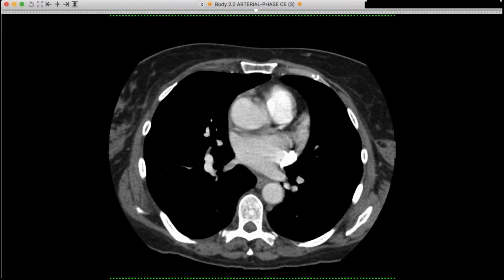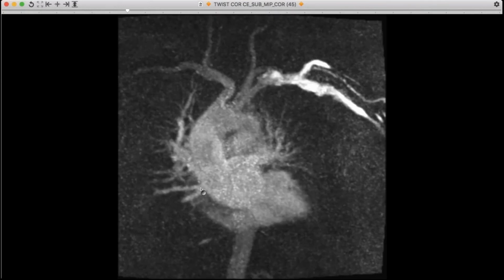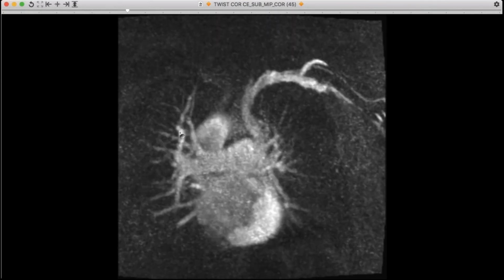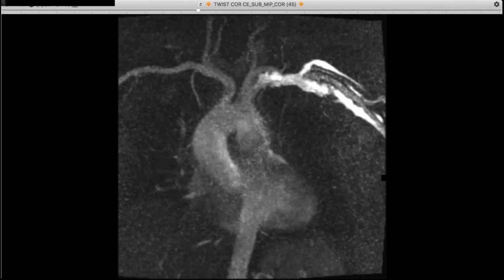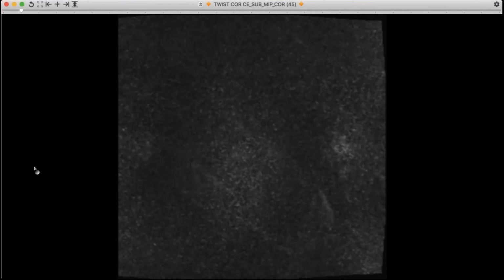Now, a cardiac MR was done, and I won't show all of it, but if I can find the perfusion image here, you can see that on the MRA. So here's a left injection, and we can see the left SVC draining into the great cardiac vein, into the coronary sinus, into the right atrium. And then there's the pulmonary artery, and we can catch the vein coming in early, going into the other side. So I have a bunch of images there. You can play around with them. But this is just an unusual one that had both.